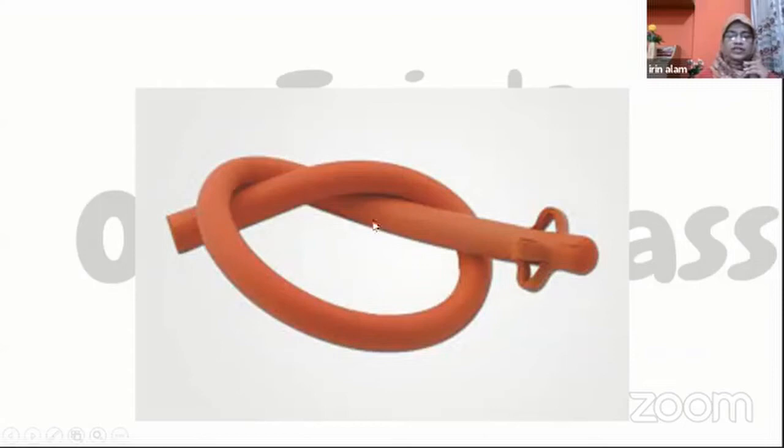We can evacuate the bladder with this plain rubber catheter before some operations, such as D&C and cesarean section. If we do not want to keep self-retaining catheters, such as Foley's catheter, we can evacuate the bladder with this plain rubber catheter before the operation.